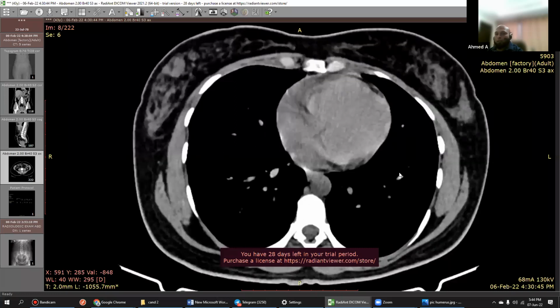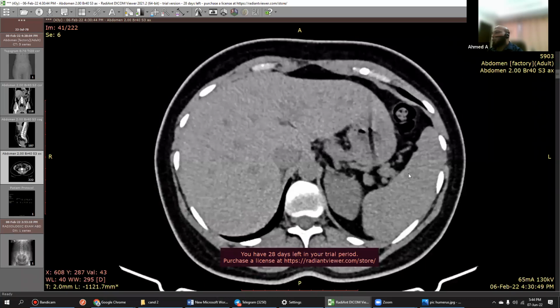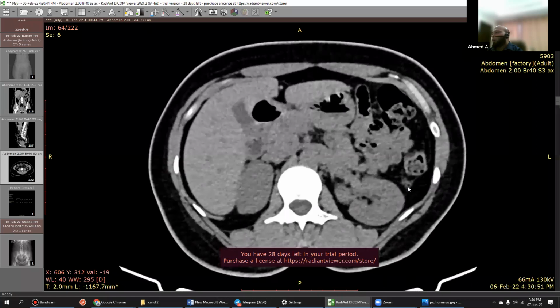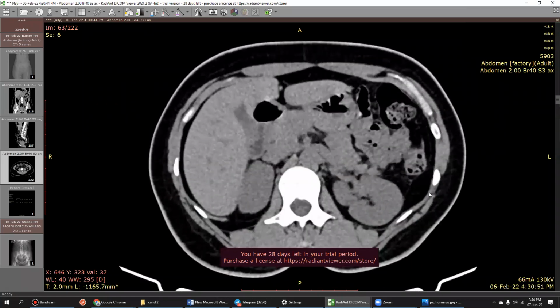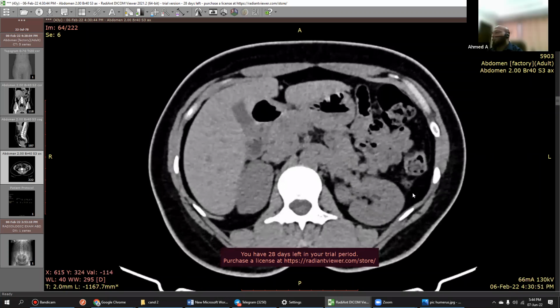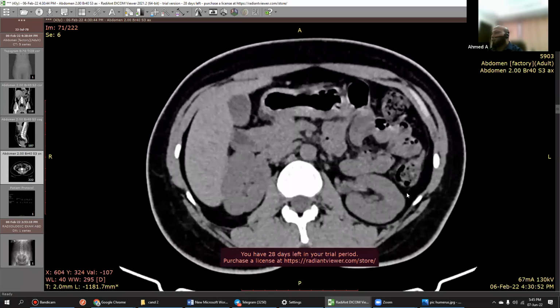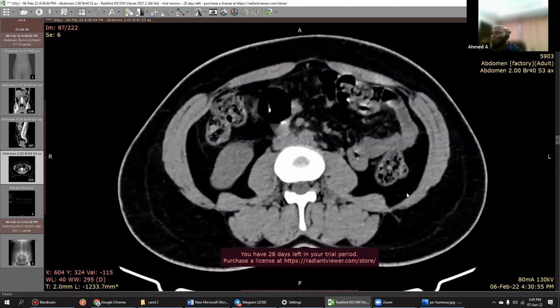This is a case of testing your eyes. That's it. Nothing else. There are cases which have more specific things, but this is the test of your eyes or judgment. If you know it, you will easily tell it. It's nothing you have to think about. Go to the left. I told you left iliac fossa. Remember the examiner's words, what he has told, because that will help you.